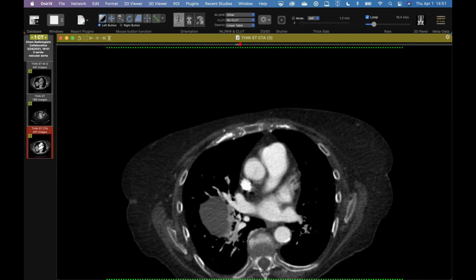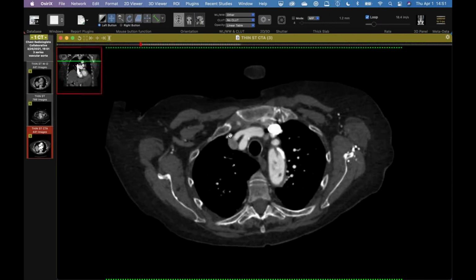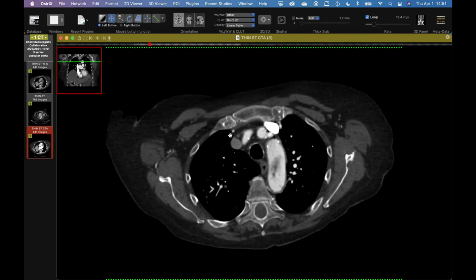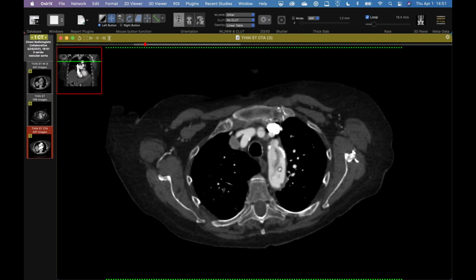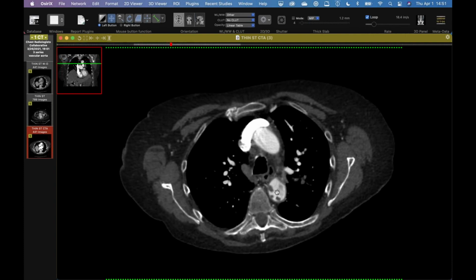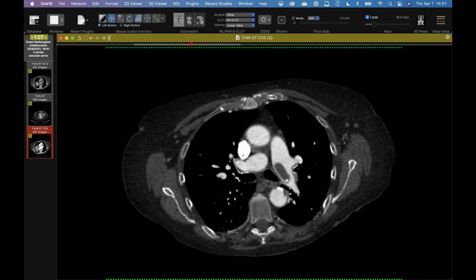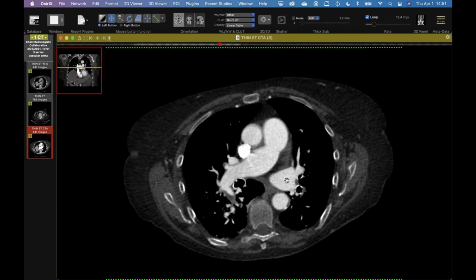But on the angio portion of the chest, we can see the whole aorta here. So look at this. We've got this really funny adherent clot, and I'll make a sagittal, and there's probably some smoke around it. And then this really adherent clot along the wall, just kind of floating in the breeze. There's our pulmonary embolism there.